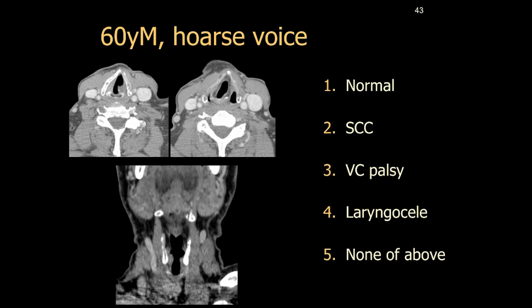Okay, a quick word on this important condition. This patient presented with a hoarse voice, and you can see some laryngeal asymmetry on the scan. What do you think is going on here?